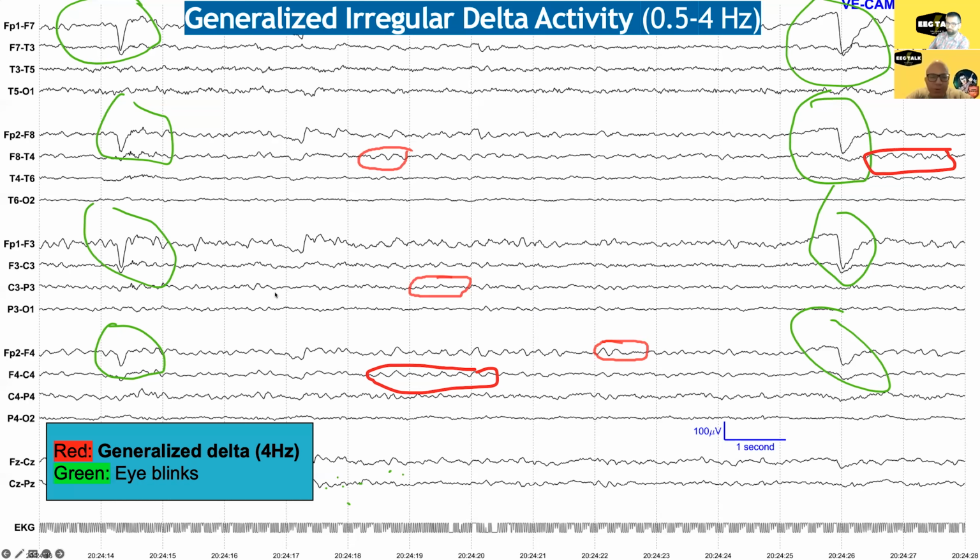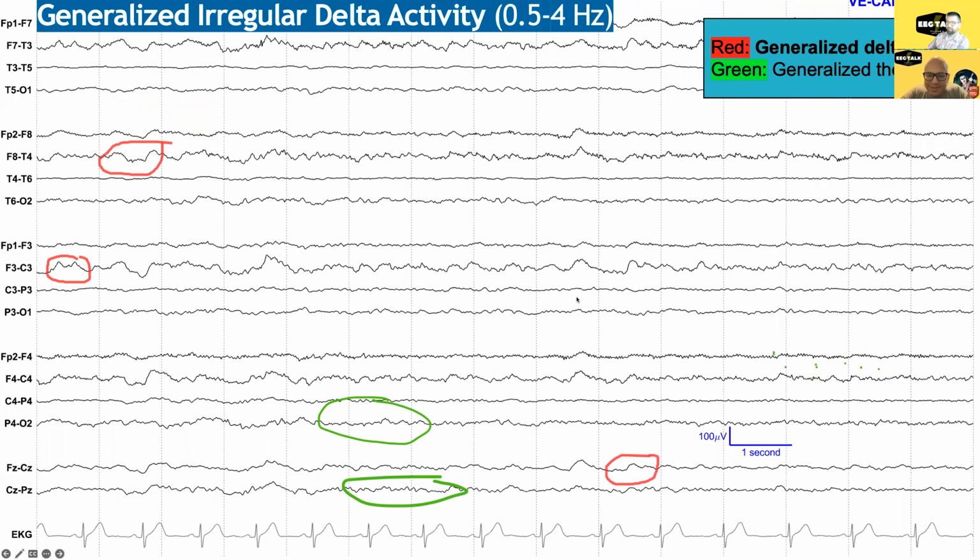Yeah, they're blinking their eyes, but it's pretty slow, so maybe they're drowsy or a little bit altered, encephalopathic. They're awake, but they're probably confused if you talk to them carefully.